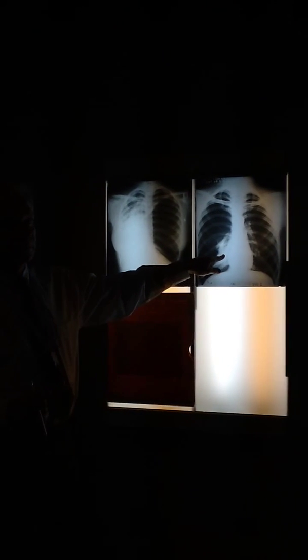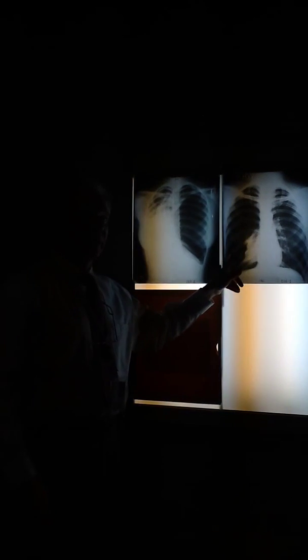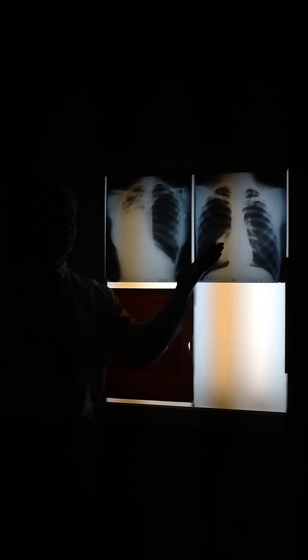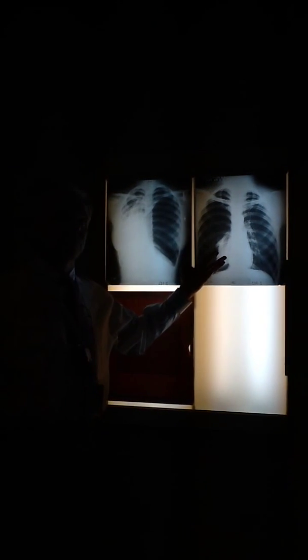Okay, so this is passive atelectasis. And over here, remember, in resorption, the two layers of pleura do not lose contact. Remember? We made a big deal about that in the lecture. It slides along, but it doesn't pull away. Did this pull away? Yeah. It has to, because you separated the two layers of pleura. So they're very, very different types of atelectasis, but they're both volume losses.